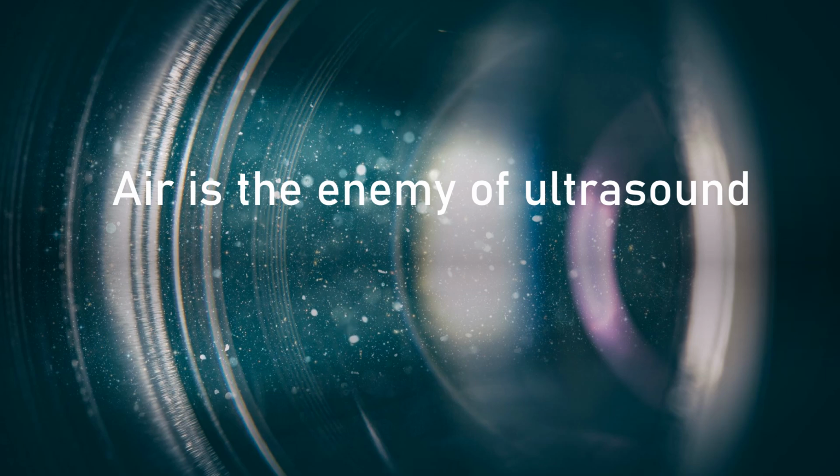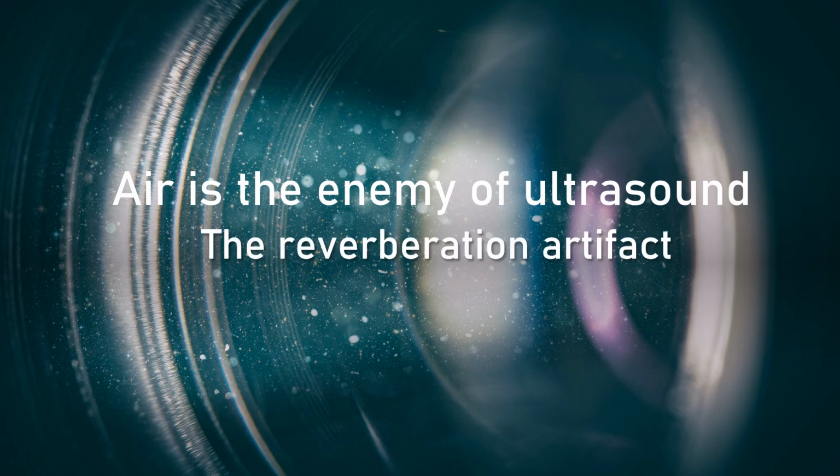But the presence of air is not always an obstacle. It can help us to establish some diagnosis. There's one artifact created by air that we'll be talking about, the reverberation artifact. Let's have a closer look at the origin of the reverberation artifact.